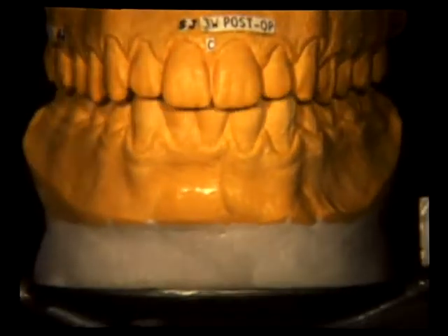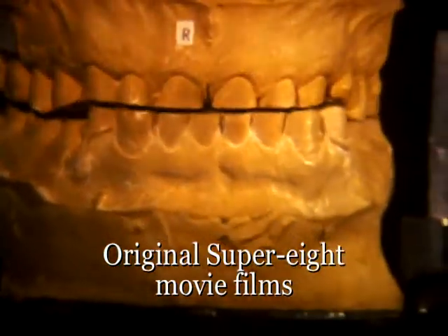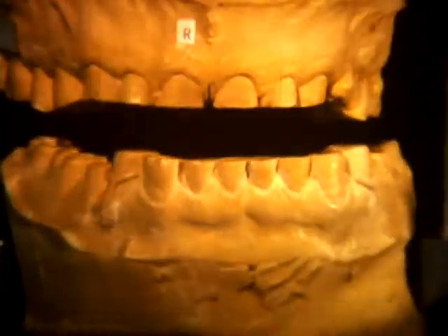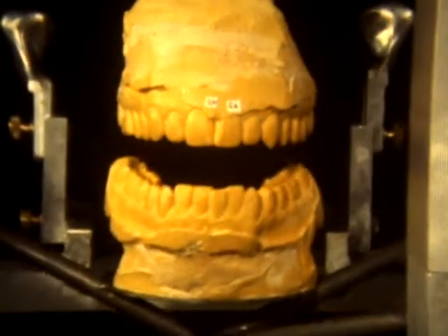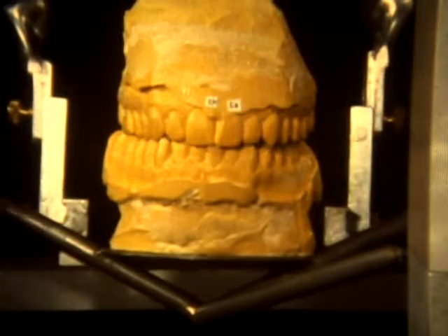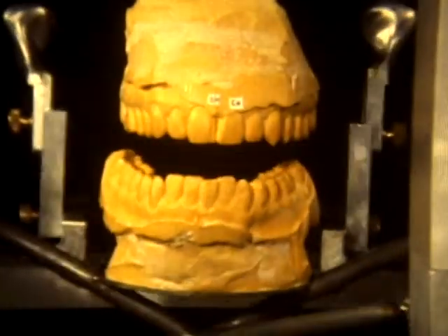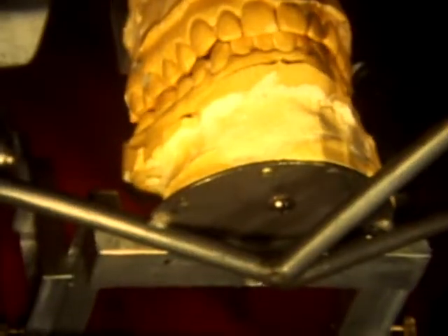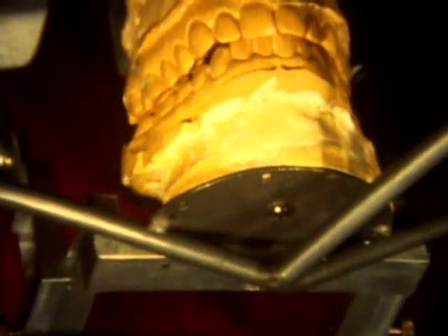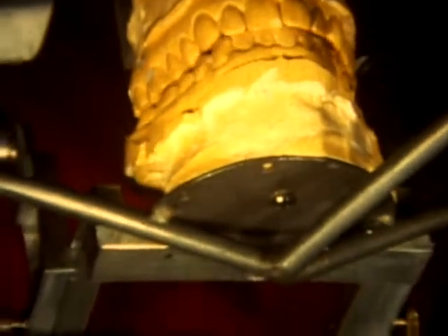The Replicator Research System made it possible to explore how people use their teeth. The actual chewing movements of a variety of subjects were reproduced with amazing accuracy. The number of different types of displays of total jaw movement varied from computer-drawn plots to representations that combined both teeth and condyles, which greatly simplified the student's understanding of a complex subject.